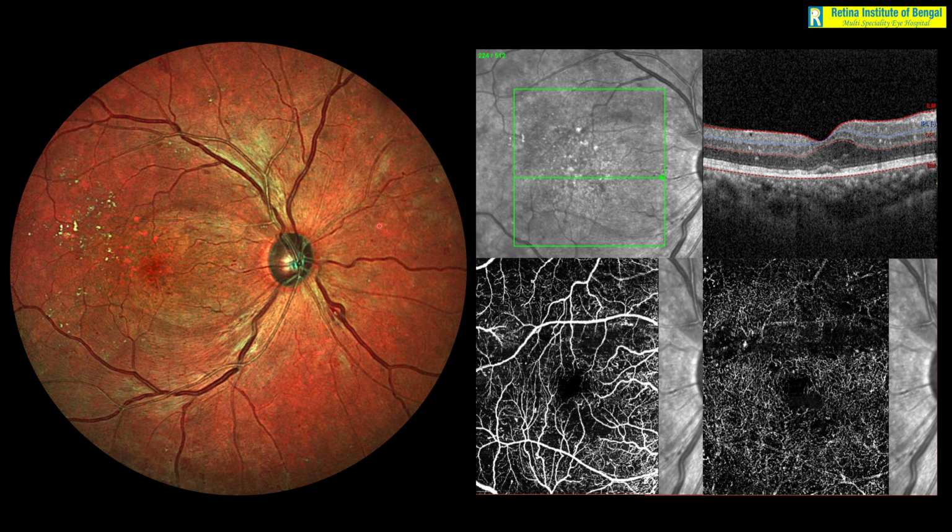So if you are just going to depend on the multicolor image and OCT in this patient, if the visual acuity is worse than 20/32, that means 6/9 or worse, then probably you will say, okay, this is a center involving DME, patient needs treatment for DME. But in the same patient, once we do a wide field angiography, which corresponds to the 55-degree multicolor image, that means both are covering the same area, we don't see any pathology at all to change our plan of action.